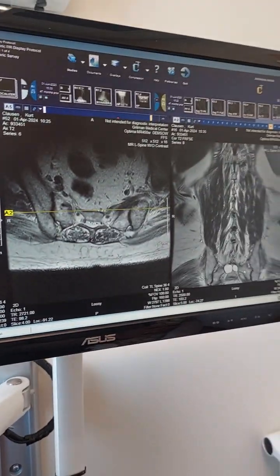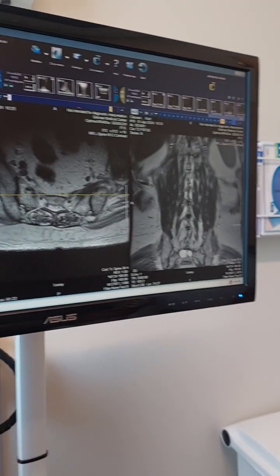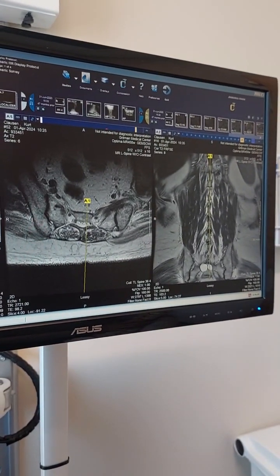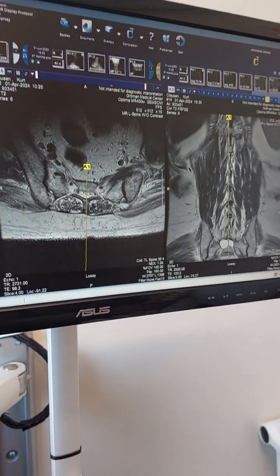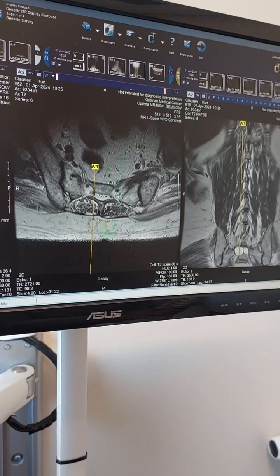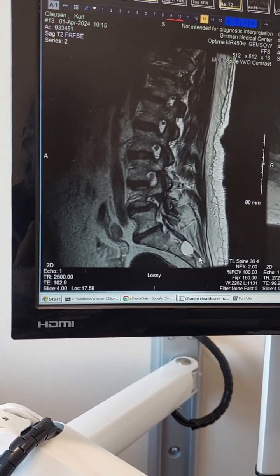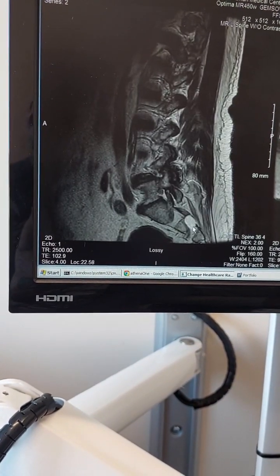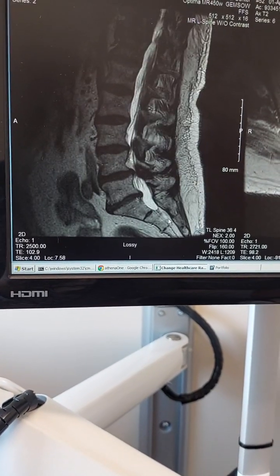So, yeah, you can really see and define them there, and we'll bring these back into view here. So that's the one on the left right there that we're seeing. And now as we move in, you see it get even bigger on the right. You can see that it's held underneath the bone of the sacrum, right? Right here, you can see how it flattens it out and squashes it, right?